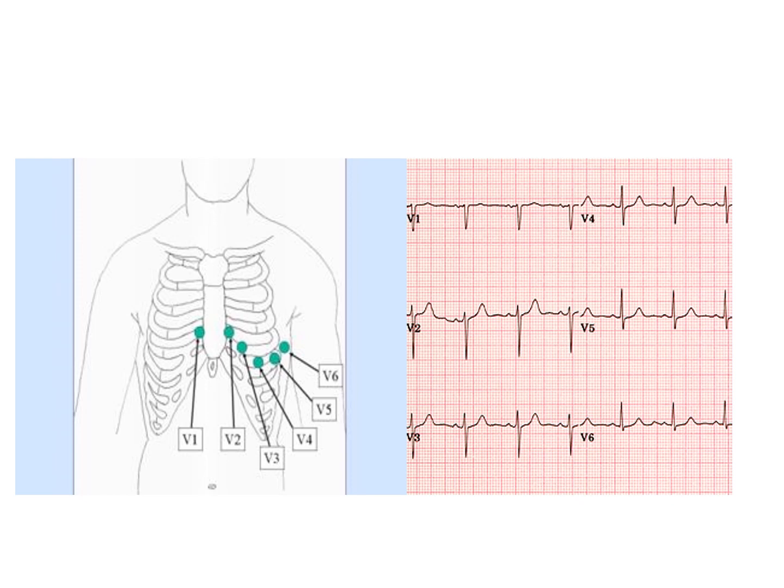So this is a normal heart. It starts completely negative in V1, and then we have a progressive buildup of positive charge as we go towards V5 and V6. This is called the R wave progression because the R waves are the positive waves, and it is caused by the leads, or where the leads are looking in the precordium, being more and more aligned with where the average heart's electricity is going in 3 dimensions.